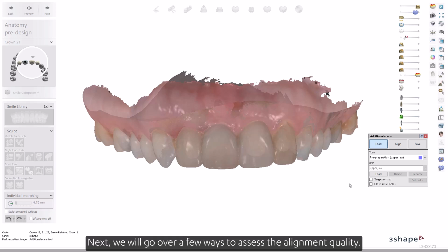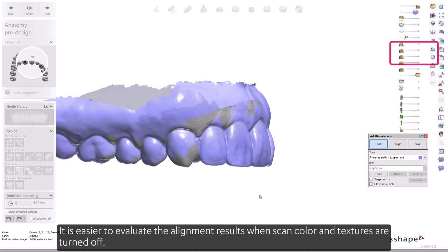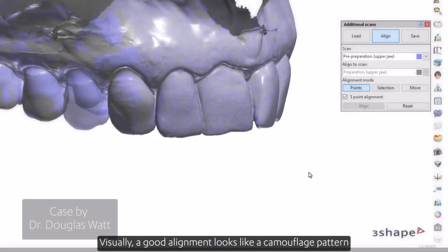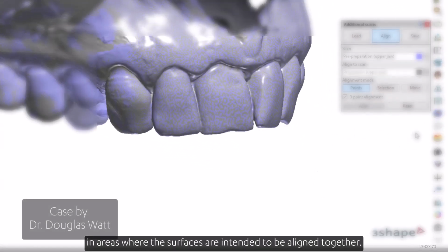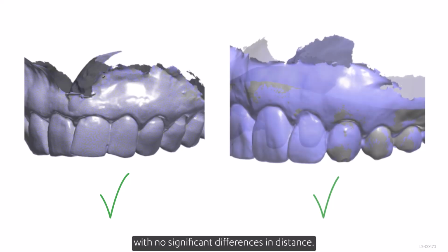Next, we will go over a few ways to assess the alignment quality. It is easier to evaluate the alignment results when scan color and textures are turned off. Visually, a good alignment looks like a camouflage pattern in areas where the surfaces are intended to be aligned together. The camouflage indicates the surfaces are on top of each other, with no significant differences in distance.